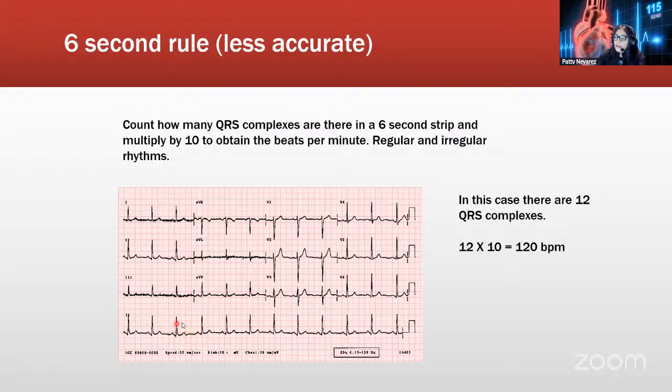And this is a little bit easier to count, but you kind of need to know the result as you go. So in this case, I'm going to start right here on a line. It has to be a regular rhythm also because I'm going to use 2 R's. So I'm going to use a combination, the large square, but it's like a faster way to count, right? Because I don't have a calculator by me all the time. So 300 or 1500 is going to be hard to be thinking in my mind.